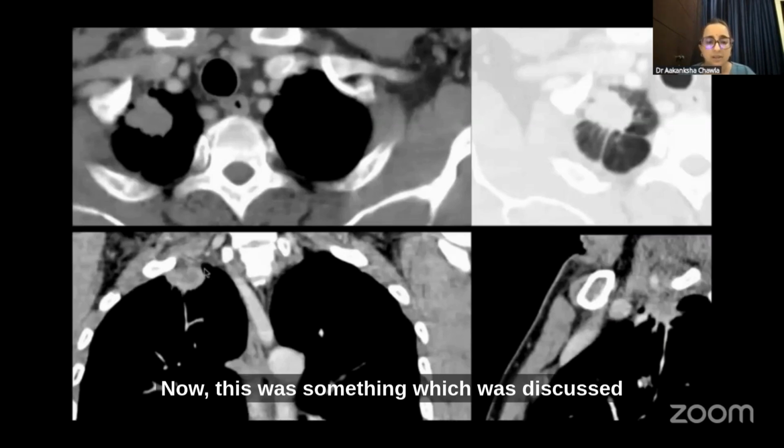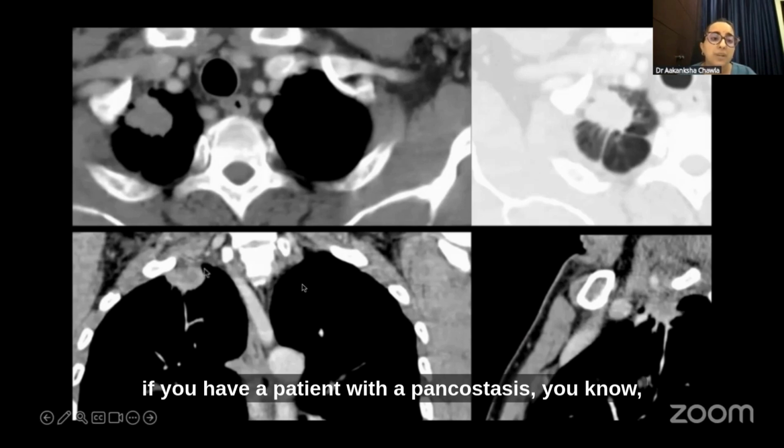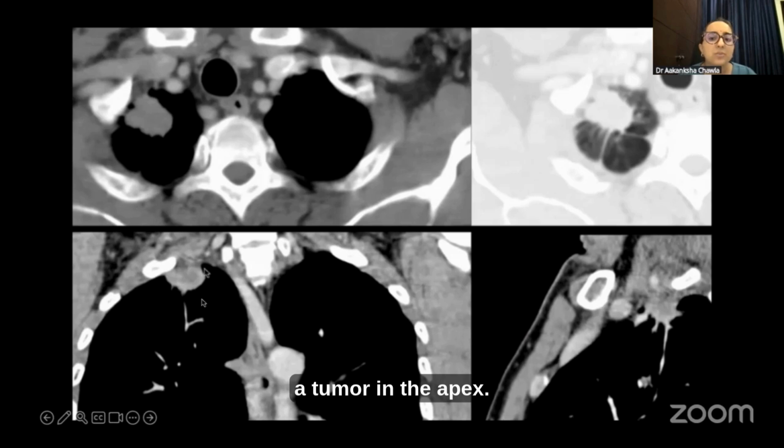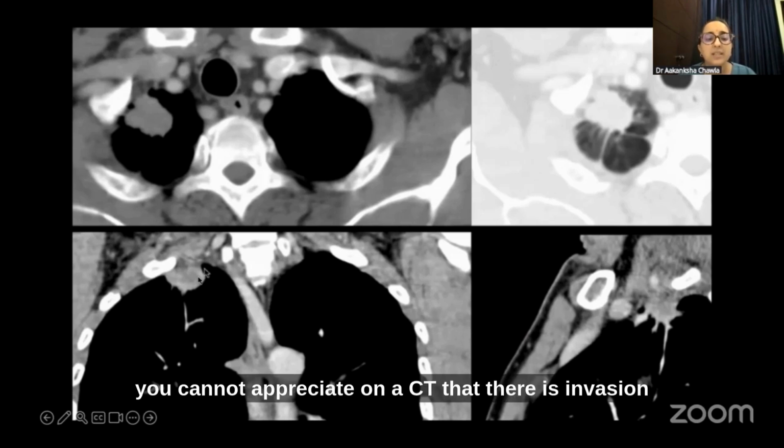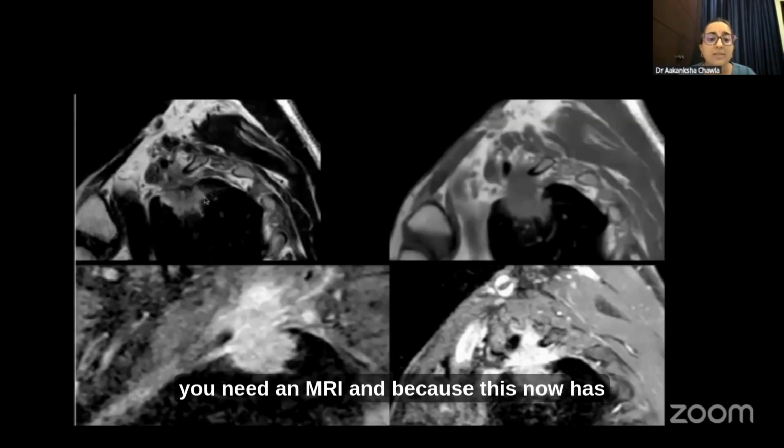Now, this was something which was discussed in the last session. And as you can see, if you have a patient with a Pancoast tumor, especially a tumor in the apex, remember sometimes, you cannot appreciate on a CT whether there is invasion of the adjacent chest wall or not. So you need an MRI. Because this now has changed the stage.